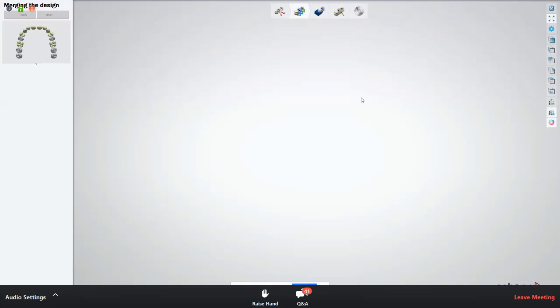Now this operation sometimes takes quite a while, but Model Builder has never been known for being the fastest of the 3Shape softwares. So while waiting, maybe some other questions came up.